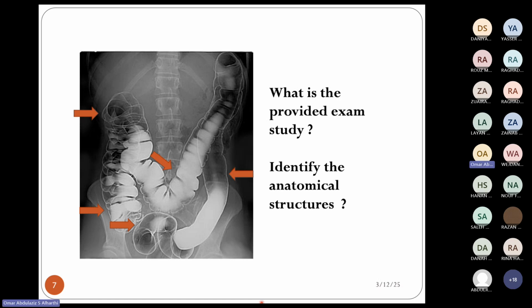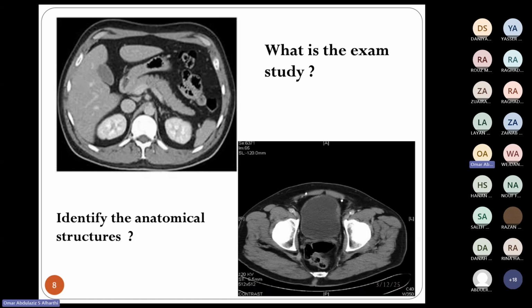Okay. All right. Again, what kind of a study is this? CT scan. MRI. It's CT, not MRI. Once you see the bones are white, you know this is CT, because MRI does not show bones as very white.